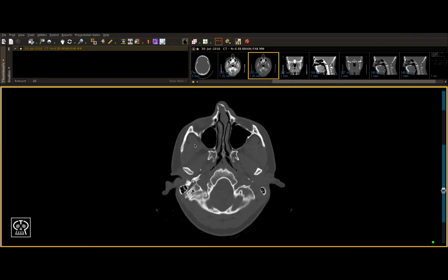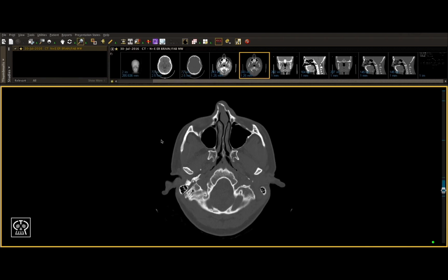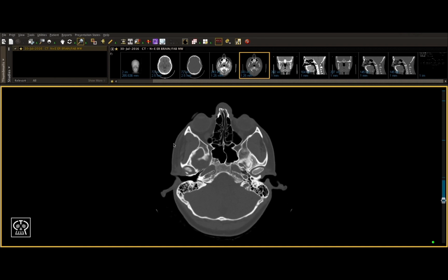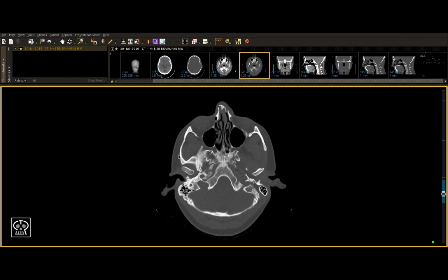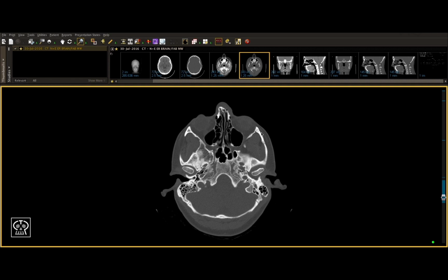When it comes to the arch, it can be tough to delineate small or minimally displaced fractures, especially ones that occur at the suture line itself. It's always important to look at the overall shape of the arch as well. Although sometimes it may look like the arch is convex, that's more because of the curvature of the temporal bone posteriorly here. In fact, your arch segment itself should usually be a straight line.